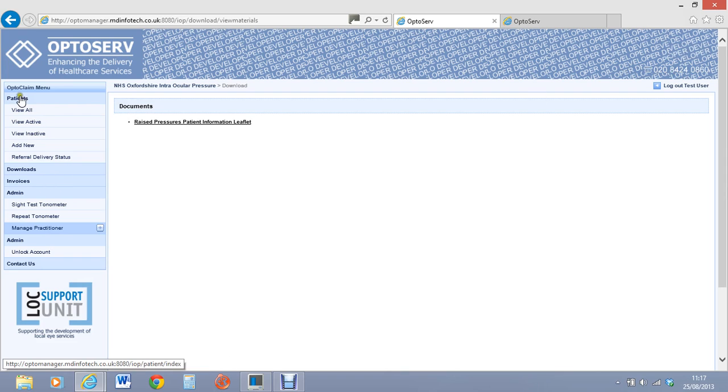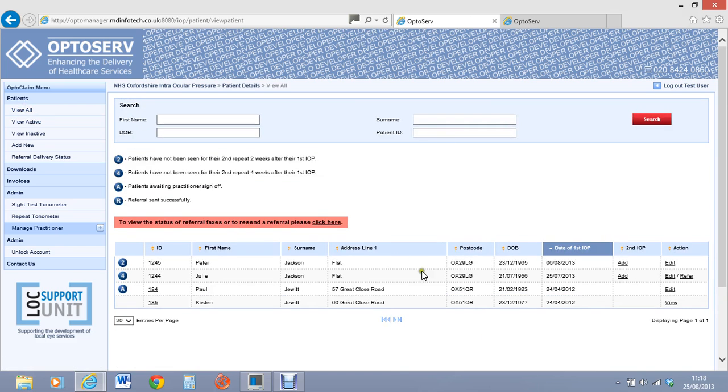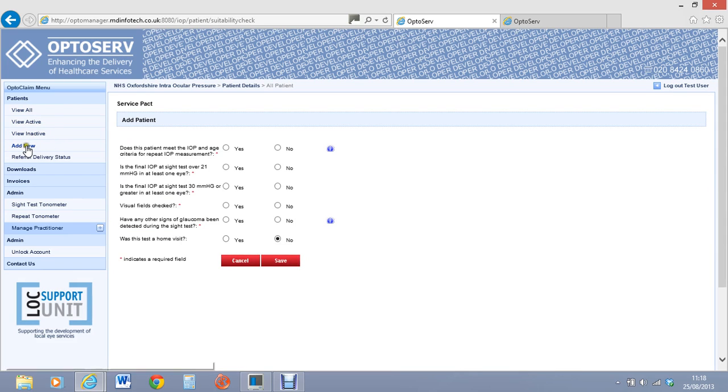Okay, so let's go through step by step of putting a patient through. So if I went to view all my patients, alright, they're all the ones that are on the system. I want to now add a new patient into the system. Alright, so Joe Bloggs has come along, had an IOP. I measured the pressures at over 21, and I think they need to have this refinement done.